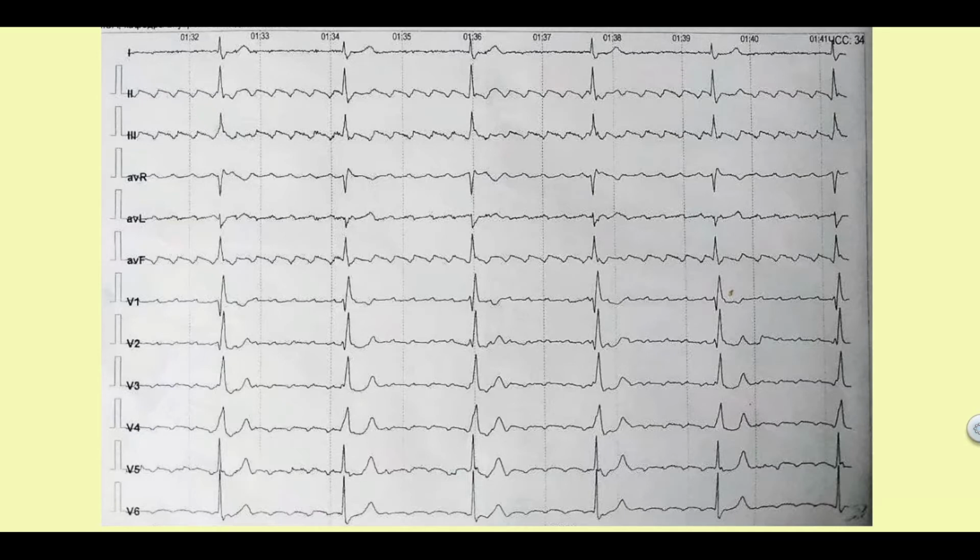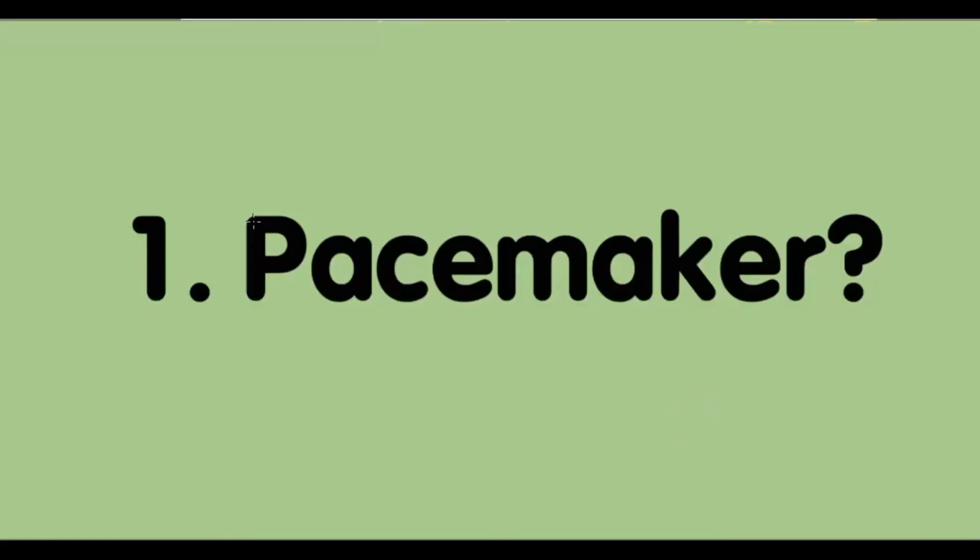Look at this ECG. Press pause and try to make a conclusion in comments. At the end of this video, we will describe the electrophysiological mechanism of this disorder. So let's go to the explanation.